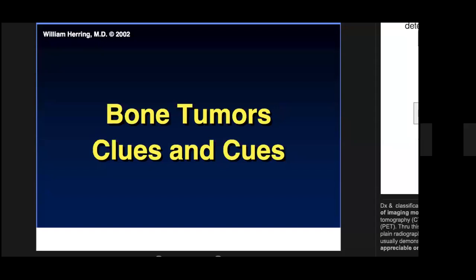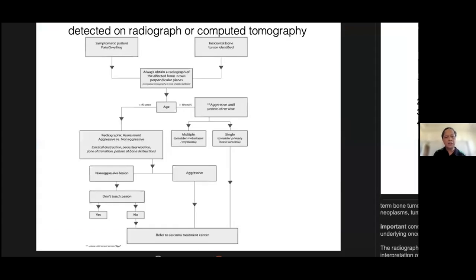So when it comes to diagnosis of bone tumors, or bone lesions, X-rays, radiographs still play a big role. In fact, it's the initial study usually done by most clinicians, before going to the more advanced imaging modalities like CT or MRI or even radionuclide scanning. If you look at this flow chart, mainly including radiographs and the use of computed tomography, you look at how basic clinical information can be used also to narrow your differential diagnosis.